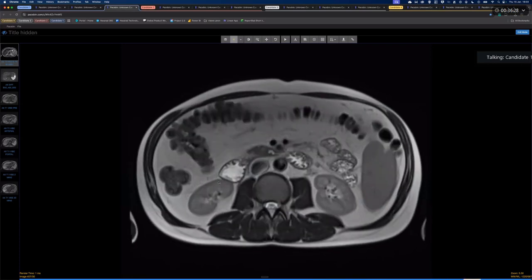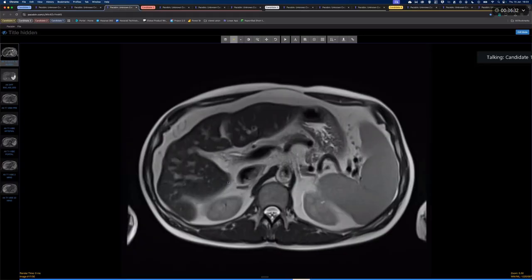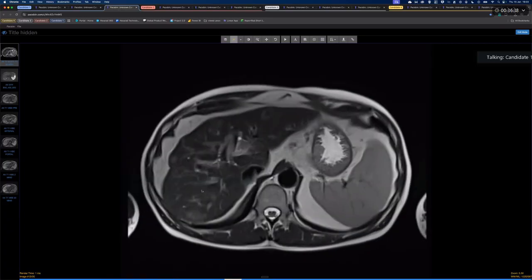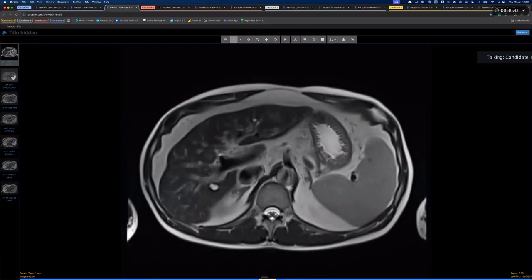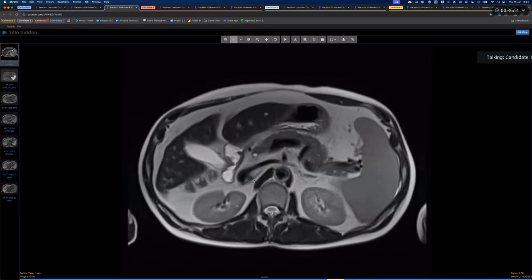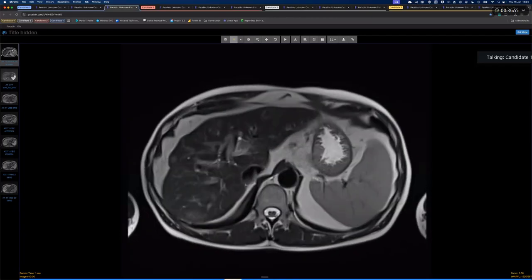I'm suspecting hemochromatosis as the main differential. So thinking of this, I would be looking for the complications of hemochromatosis, which is liver cirrhosis. The liver appears small in size with lobulated borders. I would like to check for other stigmata like hypertrophy of the left lobe and caudate lobe, which I can see. Actually, the caudate lobe is not so much enlarged, sorry.